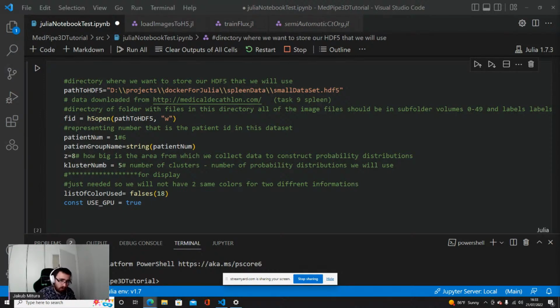You do not need to use this part of the framework. You do not need to use the metrics at all. You can use only the visualizer, or you can use the metrics, for example, to check the difference between the gold standard established by the radiotherapist and the output of the algorithm. So you can use any part of the program per se. There is nothing that would prevent incorporating and developing some algorithms in radiotherapy using my tools and other tools.